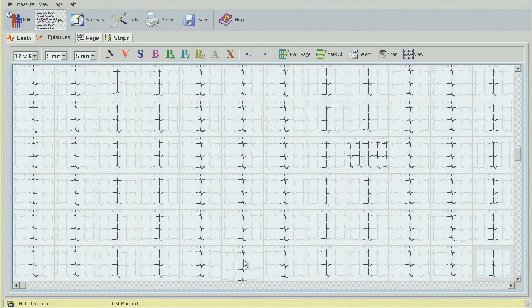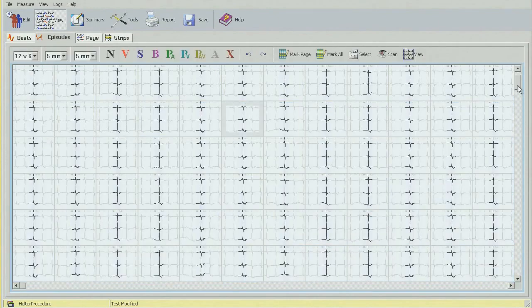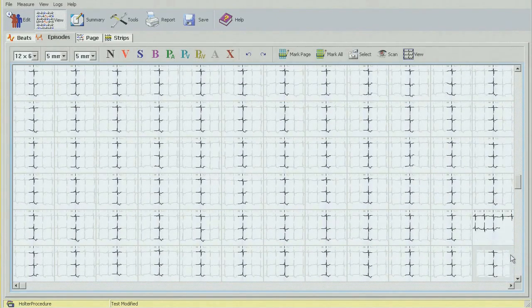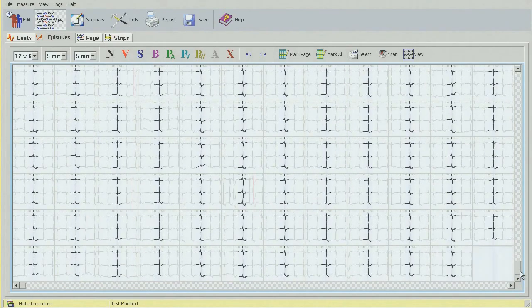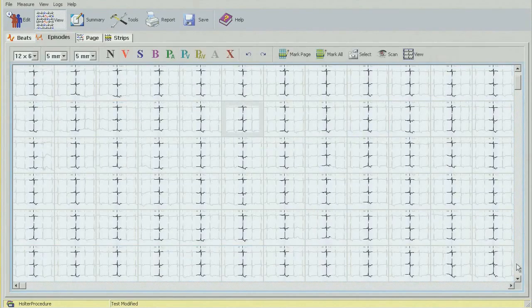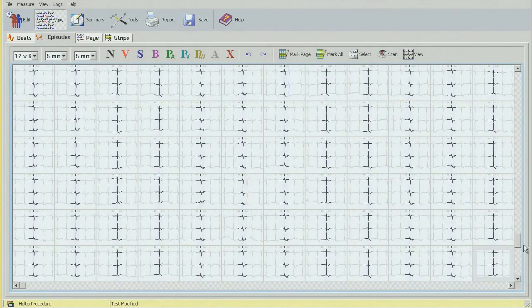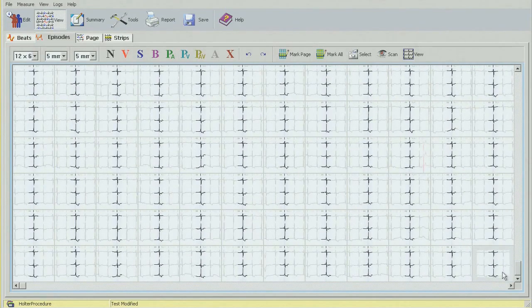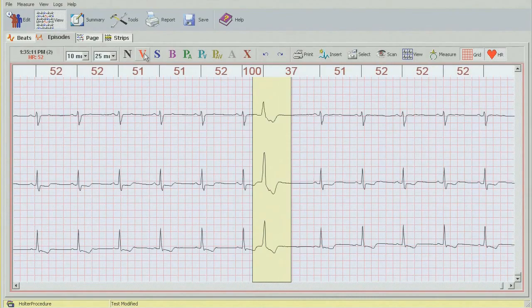This is the second one that I was looking at before. It takes us to the top of the page, so I'm just going to go halfway down. This is where we were before. Another run here. Actually, what's going to be easier is if I go all the way down and work backwards. So if you remember again, just to get down to the bottom of the page, you need to scroll this down and work backwards from there.